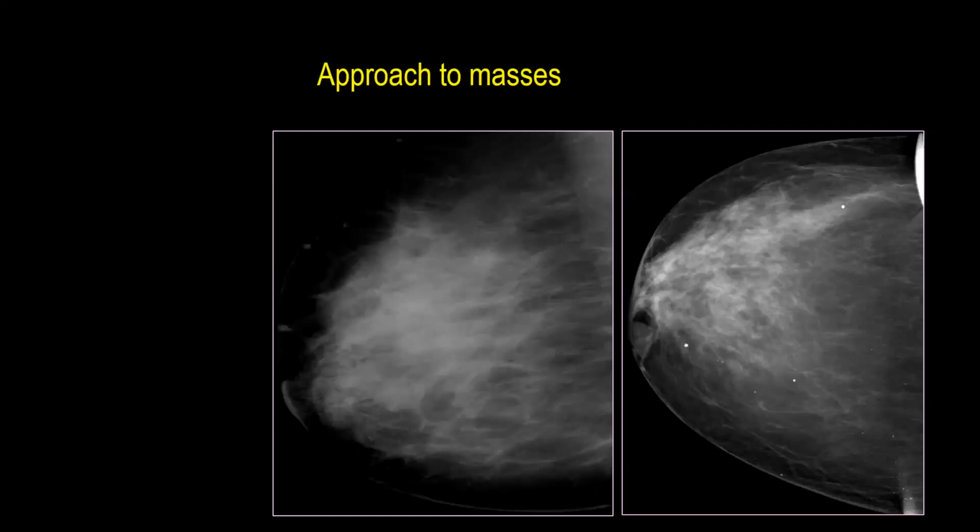What about this one? This is just a mass behind the nipple, and it demonstrates a fat fluid level. Looks like a galactocele. But she's not lactating. Look here also, the multiple ducts contain mixed densities. And this is also a dilated duct containing mixed densities. So this is a fibrocystic change. Okay? This case was fibrocystic. Also, she was my patient.